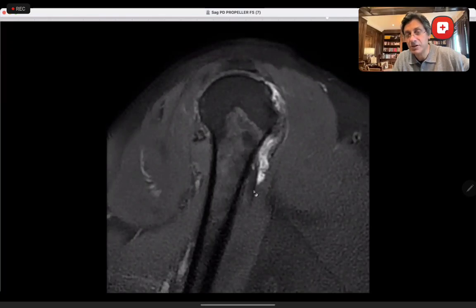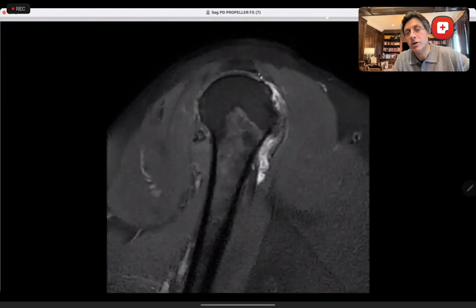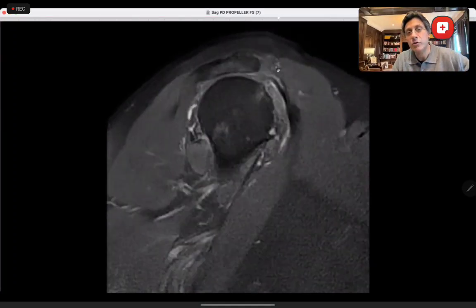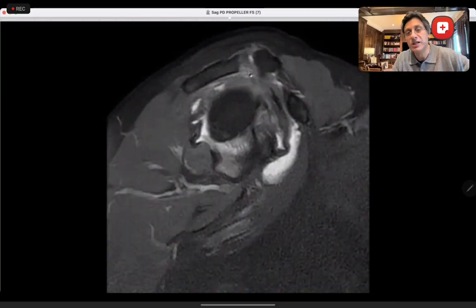Remember, this is the biceps muscle. So the other bit of the tendon. There should have been a tendon going all the way up here and then into the joint, which you don't see, which is torn. And what about the shape of the acromion? This is more like a type 2, sort of curving, probably at the border of type 1 and type 2, but you can call it type 2 because it's sort of curving like this. So this is a type 2 acromion with joint fluid, slight diastasis, a little bit of capsular edema.